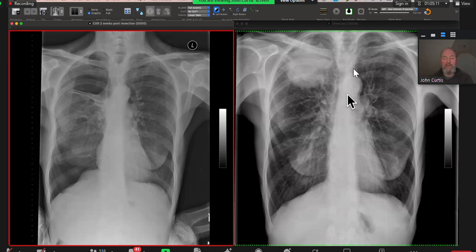How many different ways can you do a PA chest X-ray? You could ask the patient to put their hands on their hips or to wrap their arms around the cassette. This one looks as if it's by the hips. If a patient's got their hands on the hips, are you going to ignore them or look at them?